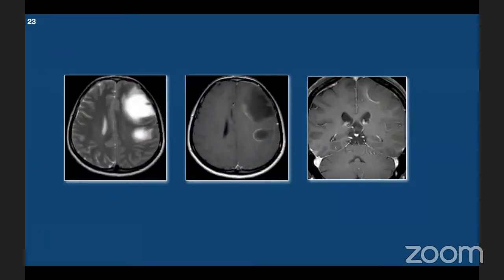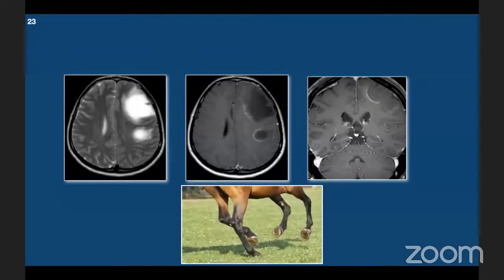This is a patient of pseudotumoral multiple sclerosis in active phase. The white matter lesions are giant with scanty and disproportionate perilesional edema. Post-contrast images reveal incomplete ring enhancement. This finding resembles the impression of a horseshoe, and this is known as horseshoe sign.